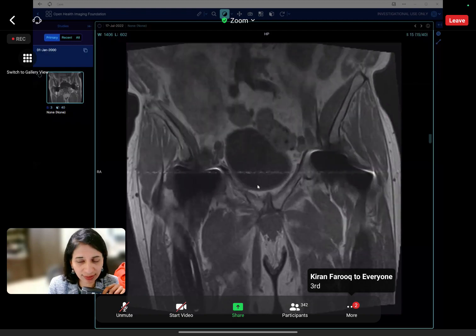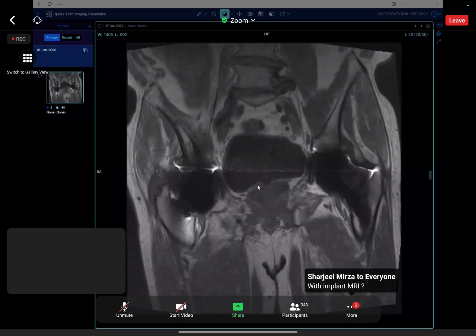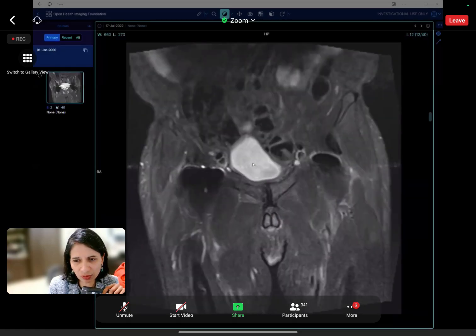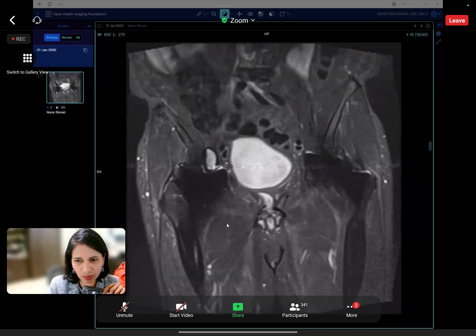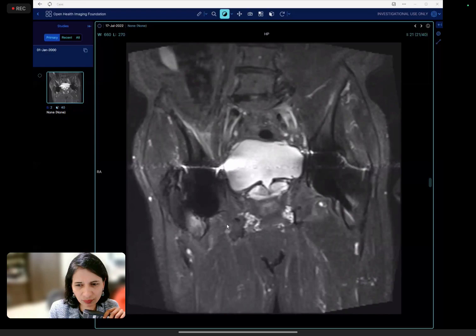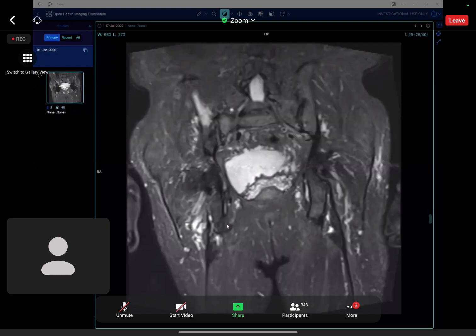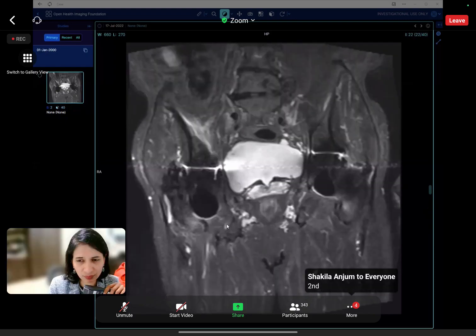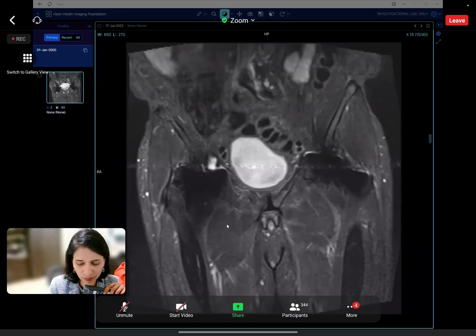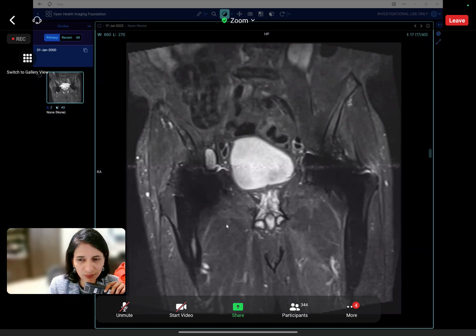I'm not sure whether you heard, it's right-sided pain. Yes, right side. So right-sided pain. I'll go back to the STIR coronal again. Please feel free to stop me at any image if you want me to go through it very slowly. I guess I didn't clarify whether this pain has an acute onset with a background of bilateral hip prostheses. I would want to ensure there's no periprosthetic fracture or loosening. No acute injury.